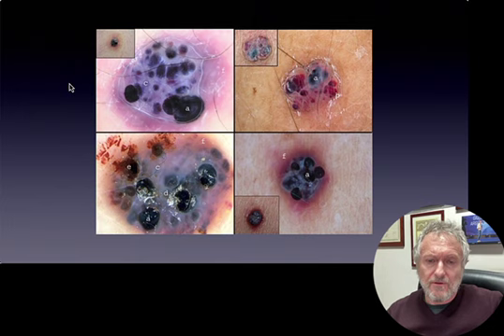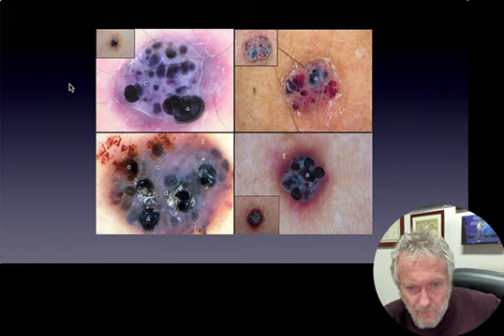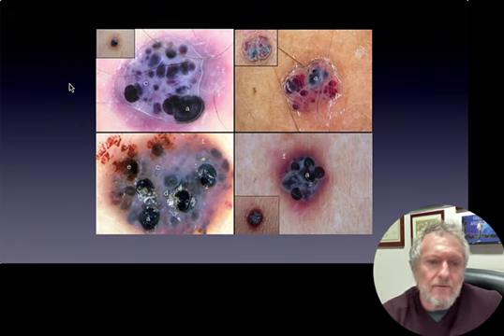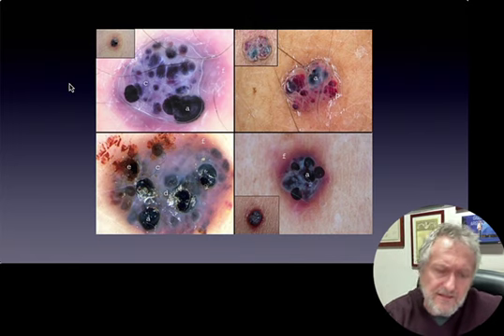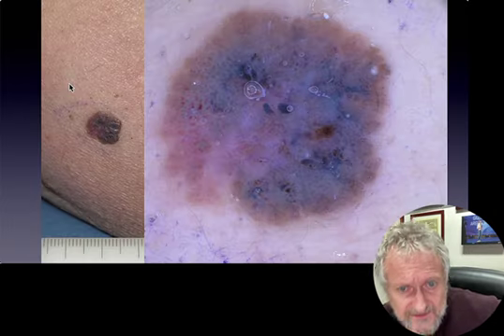So for example, here you see four very nice examples of angiokeratomas with a very prominent bluish component. Again, based on the blue color, we cannot understand what they are, but since we can clearly recognize this kind of black to purple lacunas, then we are of course able to assess these lesions as vascular lesions, and because of the presence of hyperkeratosis, these lesions can be diagnosed as angiokeratomas.